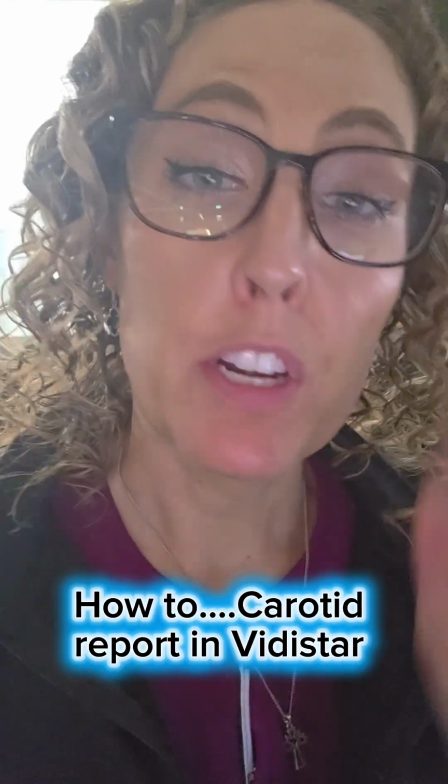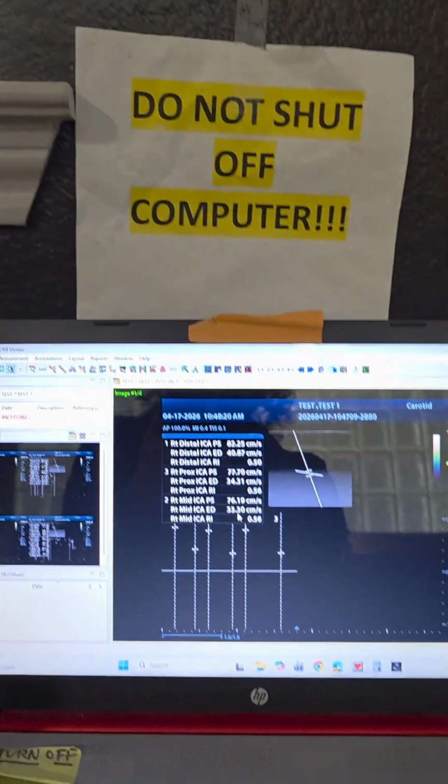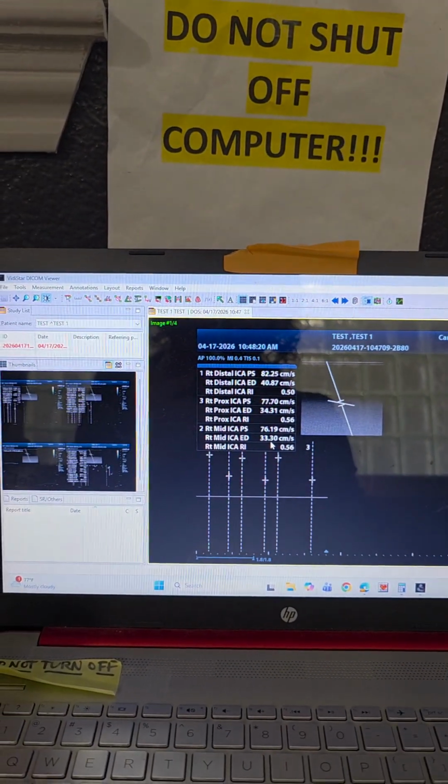Okay, guys, one more for the day. We're going to do carotid reporting in Vidistar here. Now, I've just created a mock test here because we're trying to keep patient data off of the YouTube channel. So I'm going to flip my screen around so you can see where I've actually created a test.